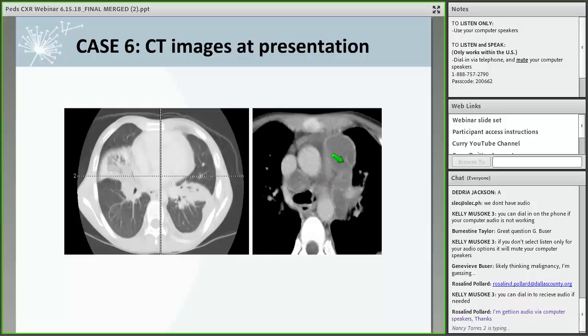Okay, so this is the same patient, and once again, within the mediastinum, this is the ascending aorta, descending aorta, and adjacent to this normal structure is a large area of very low density structures. These are consistent with necrotic adenopathy. So the findings from the X-rays are now confirmed on the CT. And then in the lung window, you can see consolidation in the right middle lobe, as well as the left lower lobe and lingular region.